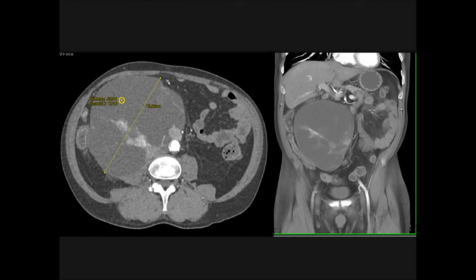This is not just a mesenteric cyst. They may have thin septations, not solid components, and they don't involve the right psoas muscle. Adenocarcinoma, nah, that's not how it looks. This is classic for liposarcoma. Most common retroperitoneal sarcoma, yes, it's a liposarcoma, but where's the fat? Liposarcomas often have minimal fat, or in this case, no fat.